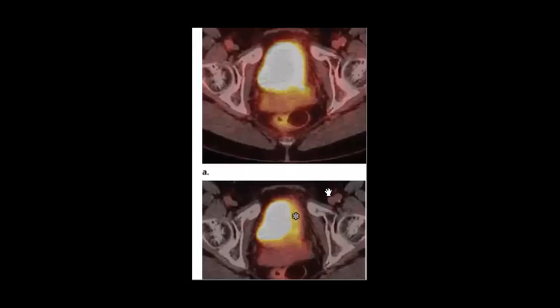They made windowing, with SUV like 15, just manipulation of the window of the SUV to a higher one. Then they try to differentiate between the excretion of the bladder and the thickening. So it involves the left lateral wall. So this was bladder cancer.